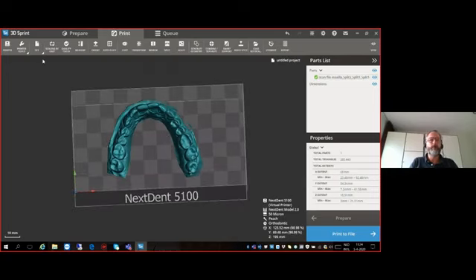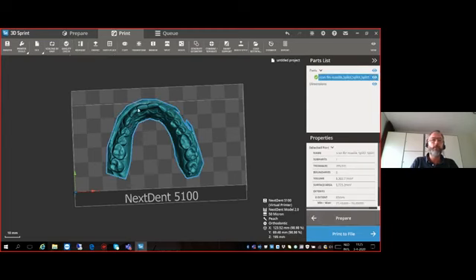We also have some other features here. Scaling. Scaling, I would not advise to open this. Like I mentioned before, the software is used on many printers within the 3D Systems portfolio, and this might be useful when working in industrial, but we do not like to scale our parts because then we lose all sense of direction when it comes to orientation, quality, etc. Quality check, you can check your part quality, but actually the blue line is an indicator that the quality of this part is good. If it's orange or red, then we should fix it.